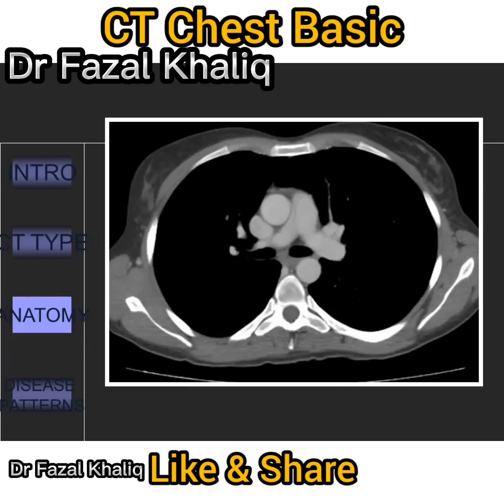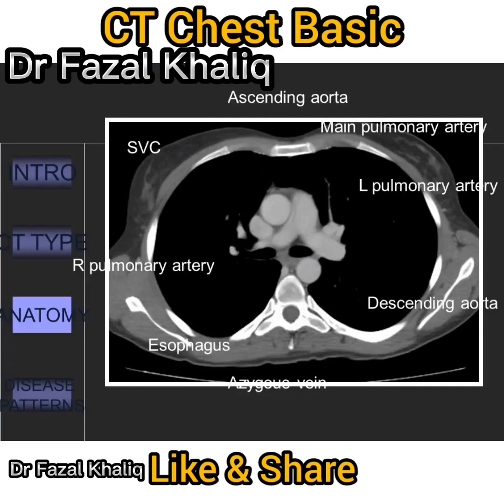And now, see which structures you can identify. The width of the main pulmonary artery should be less than 3 centimeters. If it is more, then it is likely that the patient has pulmonary hypertension. Okay, so you've got a few things. Here's a bit more of a hint.